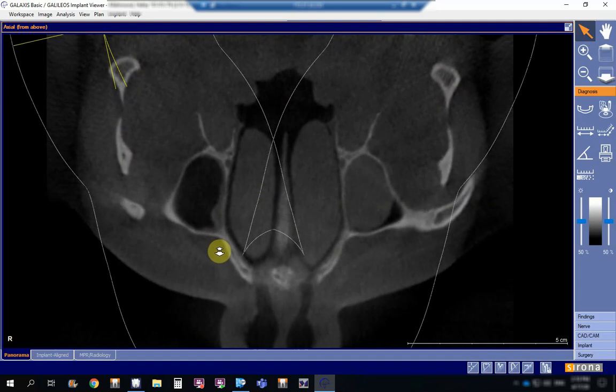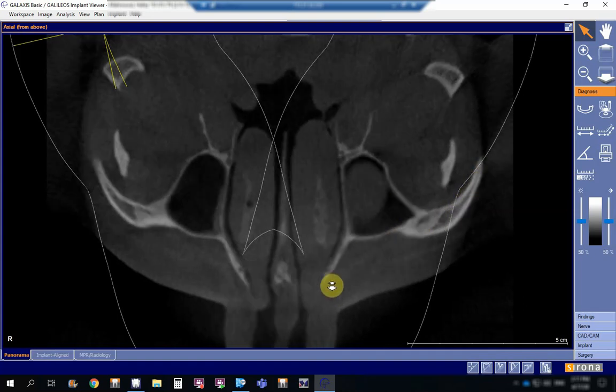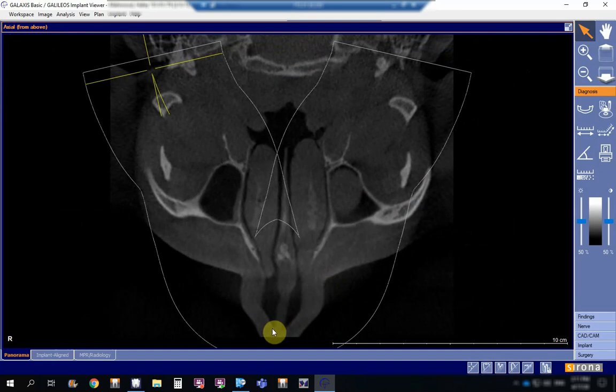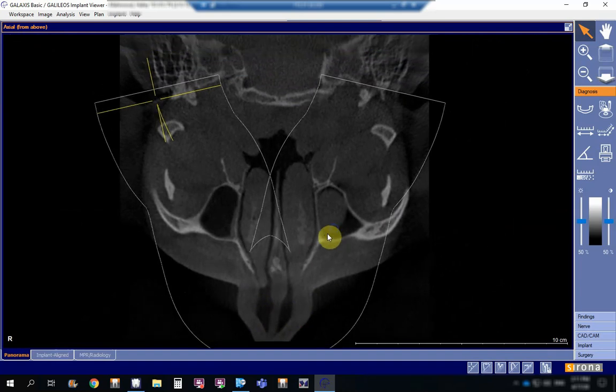I'm going up. You can see that the zygomatic process of the maxilla started to show over here, and the zygomatic arch as well started to appear. Now if I look, this is the ala of the nose, and these are the nostrils. Here there is no coverage because it is not covered in the X-ray, and the nasopharynx started to develop over here.